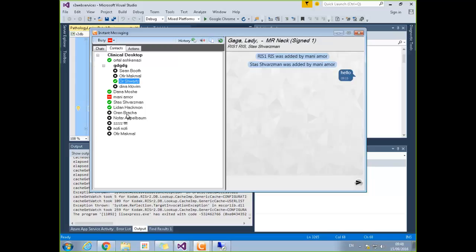But the search is very easy too. I know, but if you have to search 100 people, it might be easier to just select a group. Yeah, start to narrow it down. Maybe group first, and then search within the group, just to provide them with options to make things easier, and maybe enhance the searchability within chat, so that you could actually select all radiologists, or if there were more criteria within that search part.